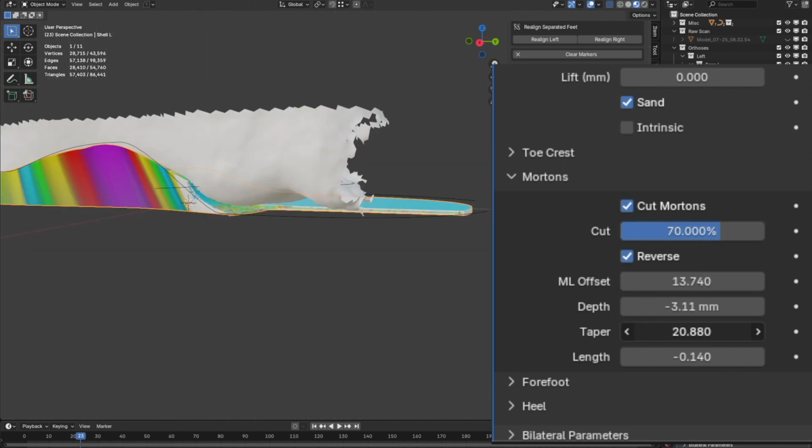Also keep in mind that this cutter is in an experimental phase of development, and that touching up the shape on the grinder may be easier than getting the exact result you want presented in the software.